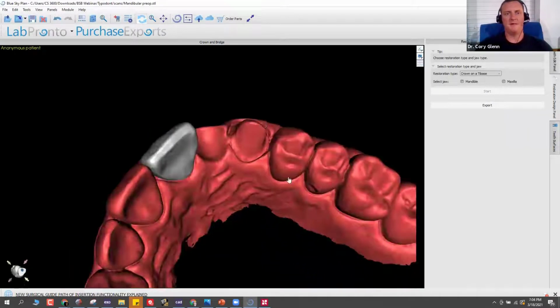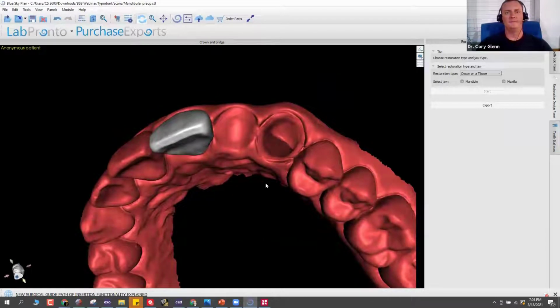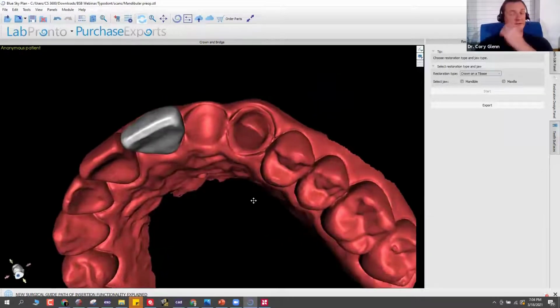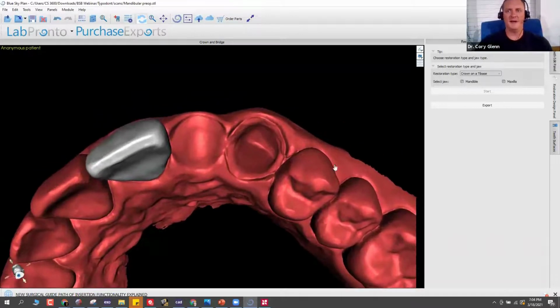And there we have the final crown on this. Now would be probably a good time to go ahead and answer some other questions, because I'm going to do the exact same process here as I talk on these two teeth. I'm just drawing a margin, I'm making the crown bottom, I'm going to finalize the crown and cut away intersections. So probably got a good 10 minutes here that I could answer questions, Michael, if there's more.